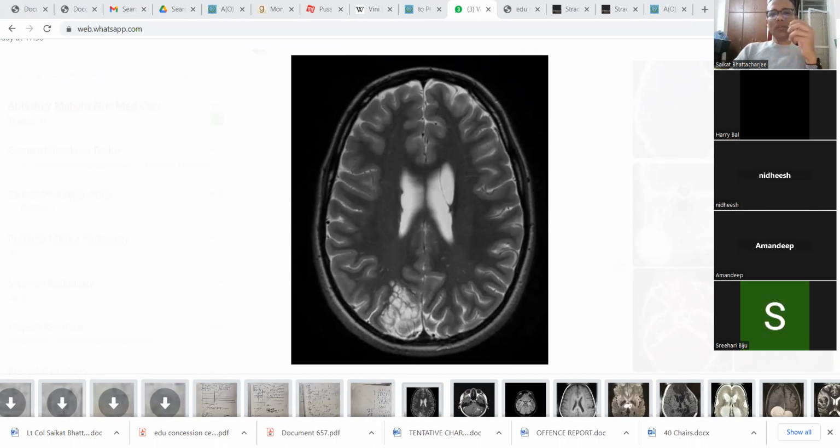Very nice. Is it the occipital lobe or the parietal lobe? Parietal lobe. Yeah, parieto-occipital. I mean, you will need a tag to determine that actually. Okay, so you have used just the right kind of descriptors. T2 hyperintense, well circumscribed, cortical base, multiple septa giving a bubbly or soap bubble kind of appearance. Patient presenting with seizure, most likely intractable seizures.